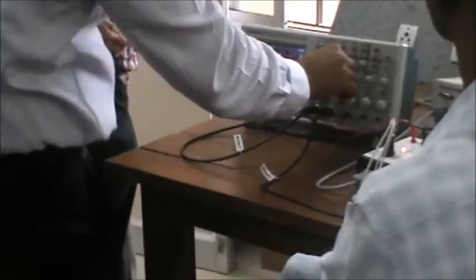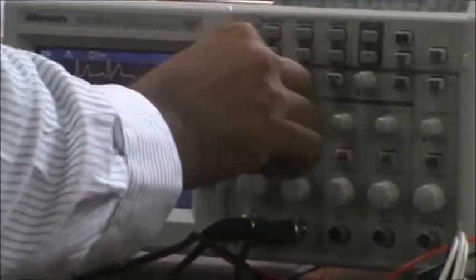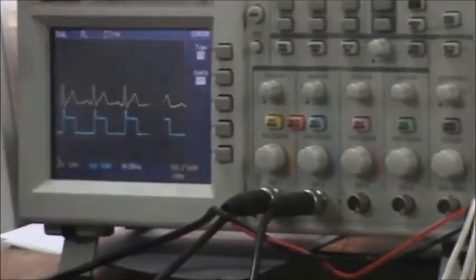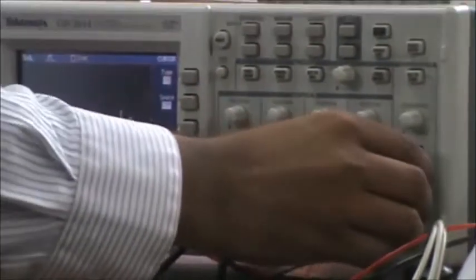So only the QRS R wave and this. So we have a pulse wherein, if you see the pulse width of this, by then the T wave has actually passed. So you don't have any other pulse getting detected.